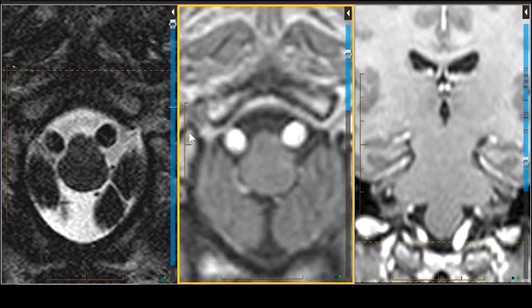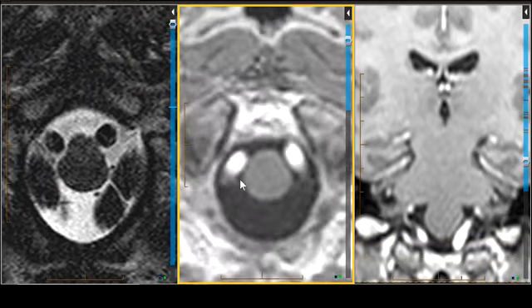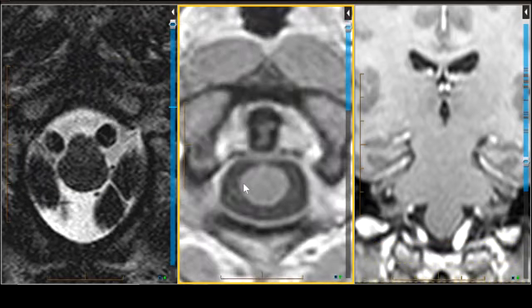Now, the hypoglossal nerve passes through the subarachnoid space. It passes the dura mater in the hypoglossal canal and in the opening of the occipital bone as we described. But after emerging, it gives off a meningeal branch. It picks up a branch from the anterior ramus of C1, and you can start to see those branches as we scroll downward right here.